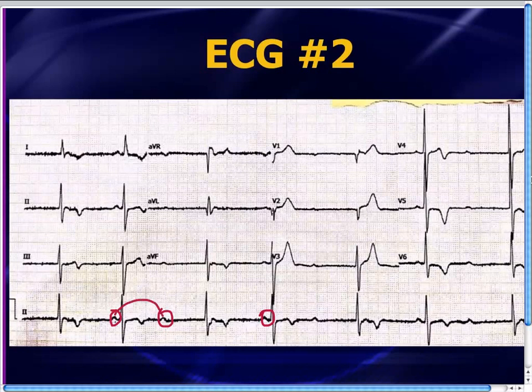So there's a P wave interval, and it maps out to that. So that must be a P wave also. And it turns out that maps out perfectly fine to there. And there's another one, maps out to that, which maps out to that, and then that rhythm continues on all the way across the EKG strip. So once again, we've got sinus rhythm.